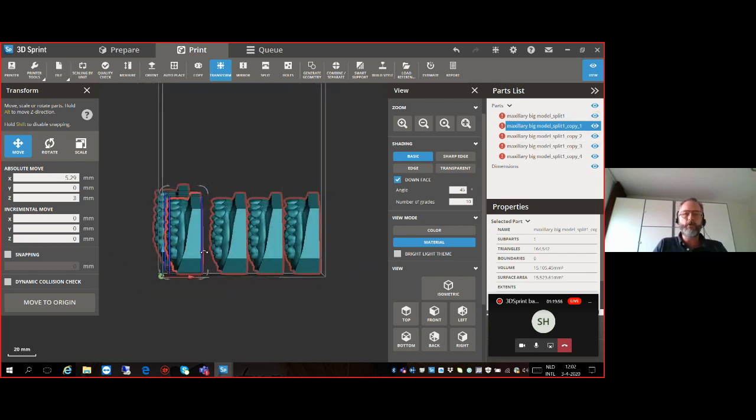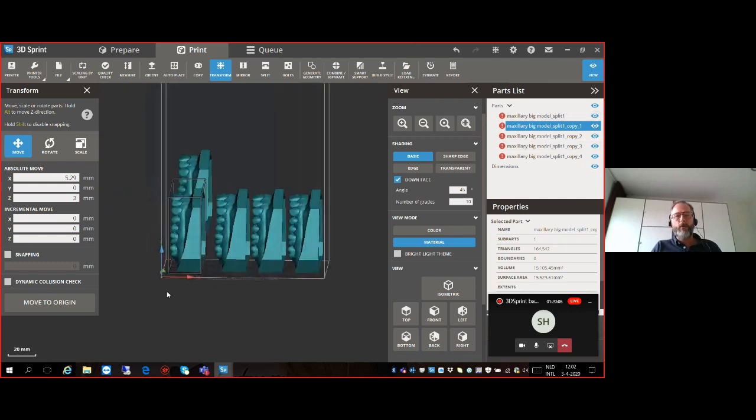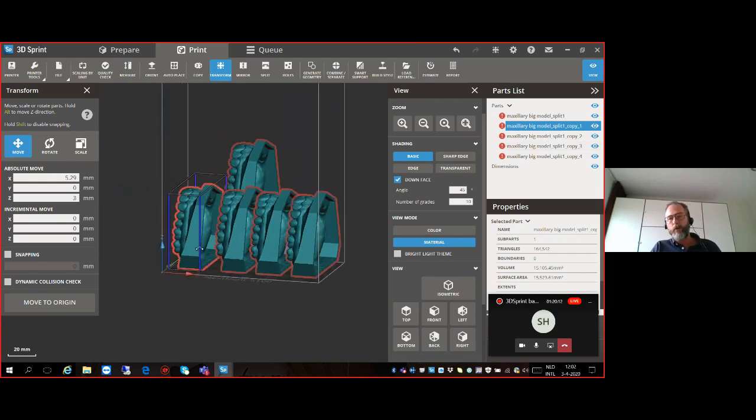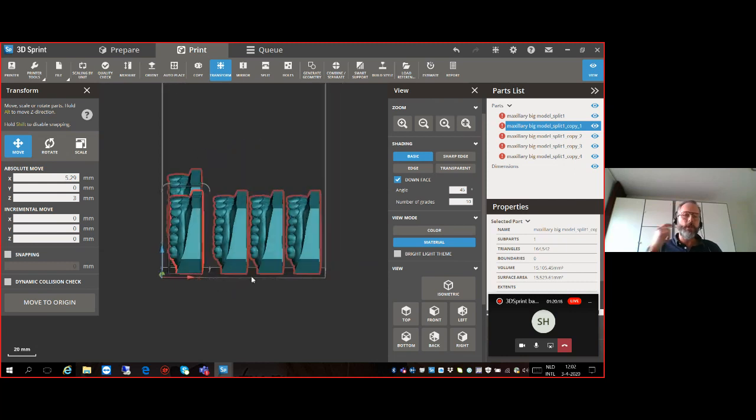And yes, we are happy to announce that we will release an awesome feature, free of charge by the way, in the latest upcoming update that's called Stacked. What will happen is that you will load in all the different orthodontic models. It doesn't matter if they're closed or, let's say, hollow to a certain degree. It will make them all the same when it comes to the model thickness. It will create supports.